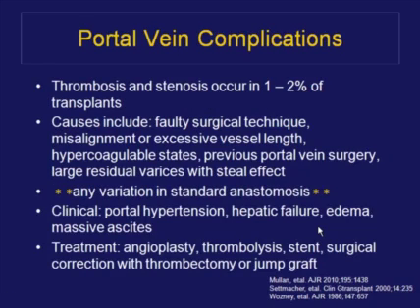And turning now to portal vein complications, these are relatively rare. There are not as many kinds of complications as in the hepatic artery, but there can be thrombosis and there can be stenosis. Whether or not these come from faulty technique or other issues isn't clear, and then one has to always be careful if there are large varices left behind that there can be a steal effect. It's important to know if there has been any variation in the standard anastomotic procedure in the operating room so that you can appropriately evaluate.